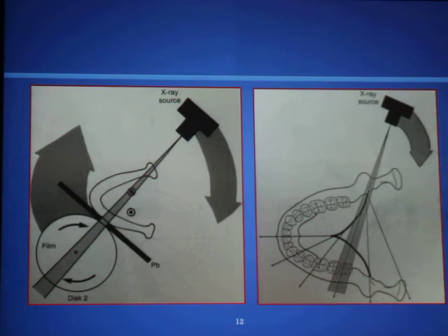The basic concept of how the cone beam CT works, as the name says, cone beam, is that the beam of the X-rays is cone shaped. And again, the concept is no different than a panoramic machine, where the X-rays are emitted from the source, and it travels from the source to the object, and in the form of a cone.